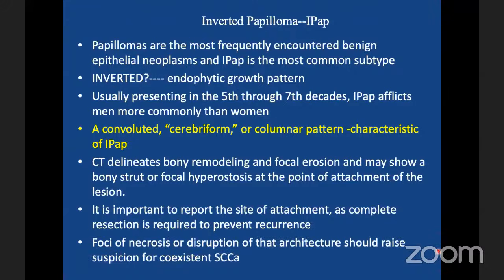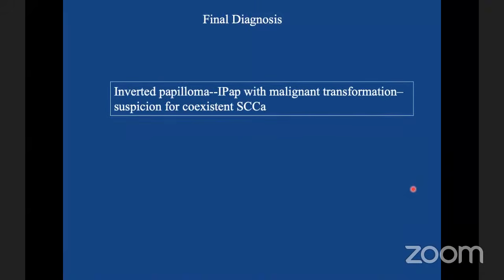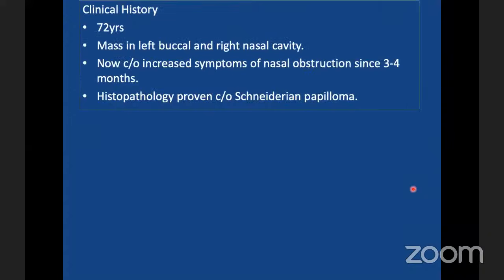Foci of necrosis, disruption of the architecture, or, as I showed you, severe destruction of bone, should raise suspicion of coexistent tumor. So the final diagnosis in this case was IPAP with malignant transformation with coexistent squamous cell carcinoma.